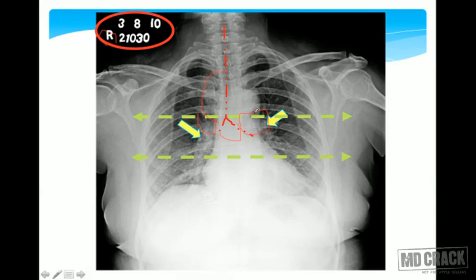So in any X-ray chest where you might find that there's hilar enlargement, you need to know whether it's due to the pulmonary vessels, or due to lymph node enlargement. Obviously, another thing might be you might even have a CA lung, but these are the more common causes of hilar enlargement.